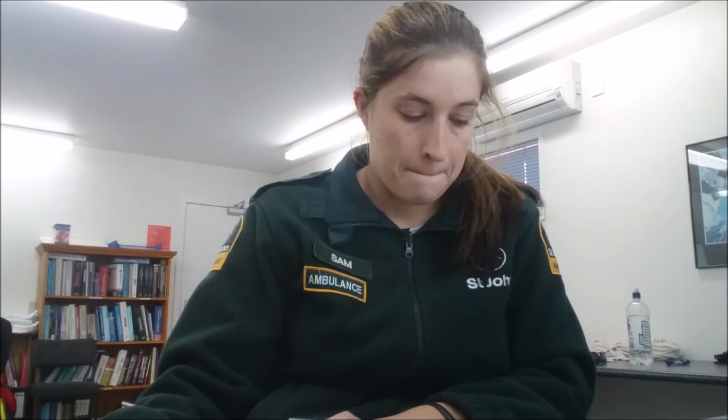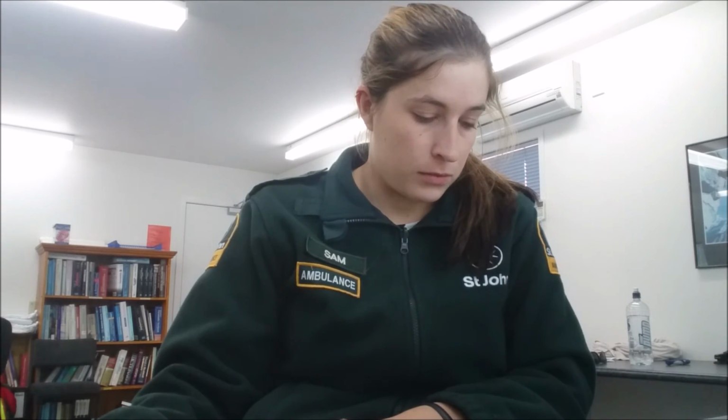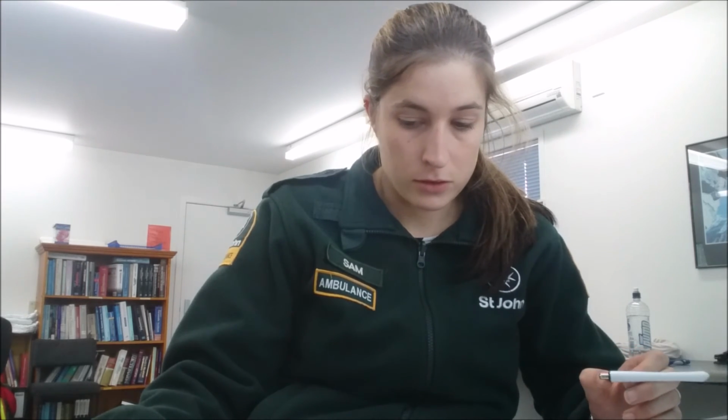Okay, so two questions. What information in her history corresponds with the LVH seen? So she was a smoker, I think. Yeah, smoker. She already has heart disease. Hypertension. Yeah, she's not compliant with her meds either.